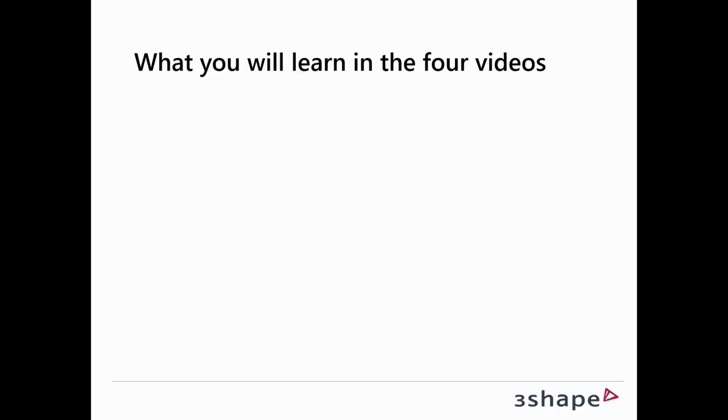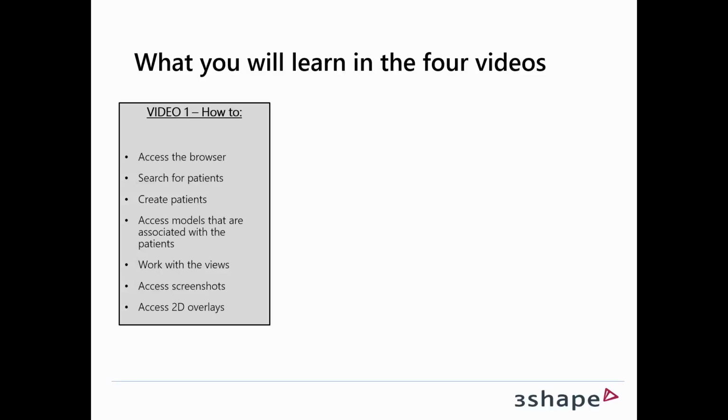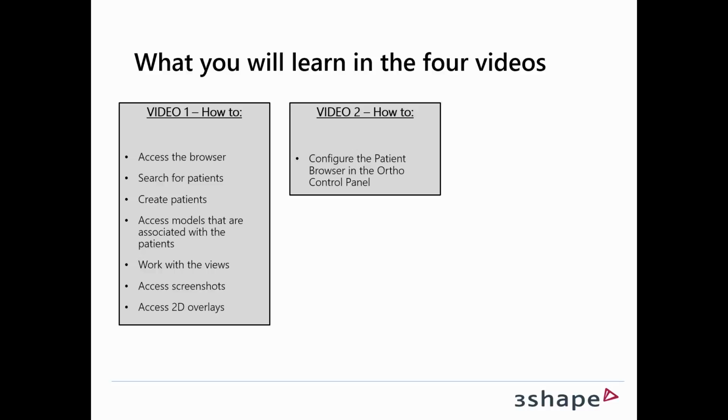So what will you learn in the 4 videos? The first video, which is this video, will teach you how to access the browser, how to search for patients, how to create patients, and how to access models that are associated with those patients. It also tells you how to work with the views and how to access screenshots and 2D overlays.